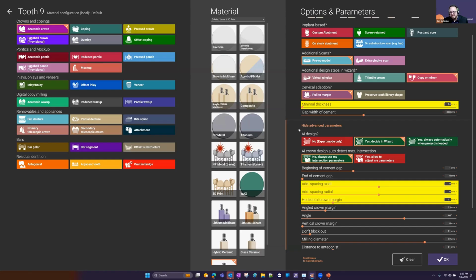Anytime you can do any step, whether it's a step that's been completed or a step that's further along in the wizard workflow, you can bounce around, change things, recalculate, we'll say the internal fit, load new scans, replace existing scans. It's pretty amazing how you can have that flexibility and just take care of what needs to be done at any time with our software.